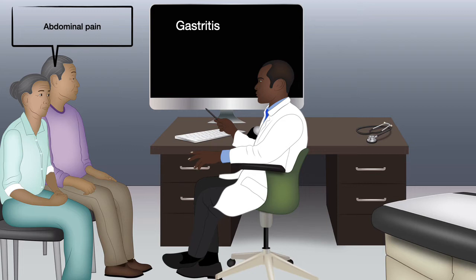You may see ulcers, either in the stomach or duodenum, or you may even see cancer. So patients with abdominal pain, especially upper abdominal pain, you perform an EGD to see whether any of these conditions are causing the abdominal pain.